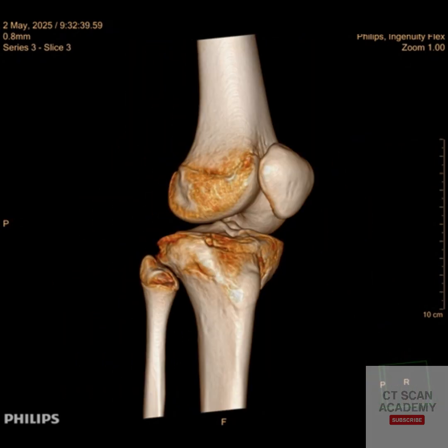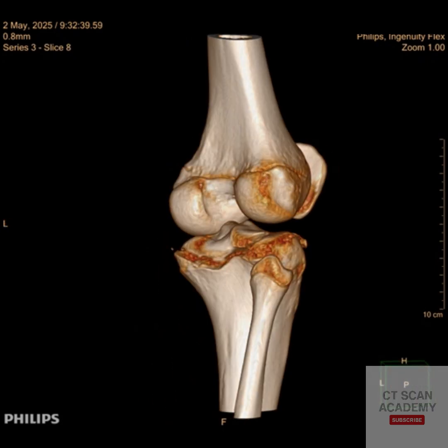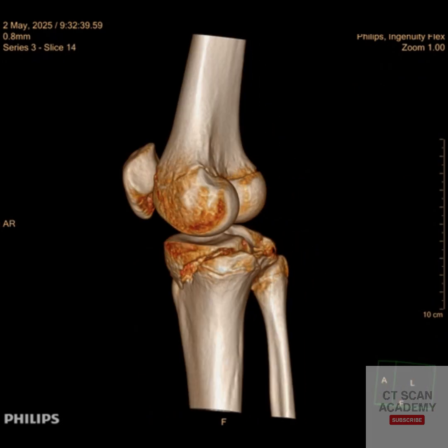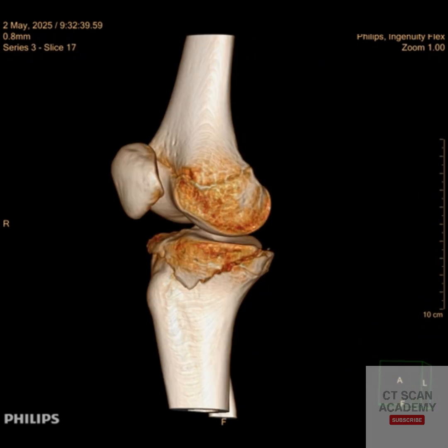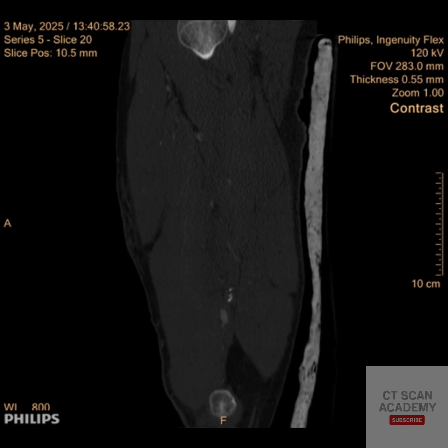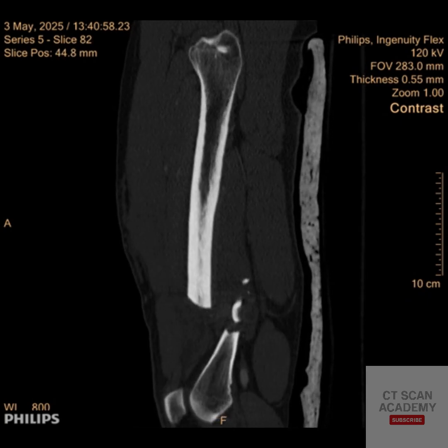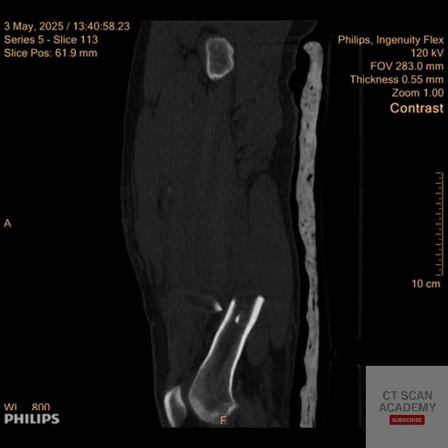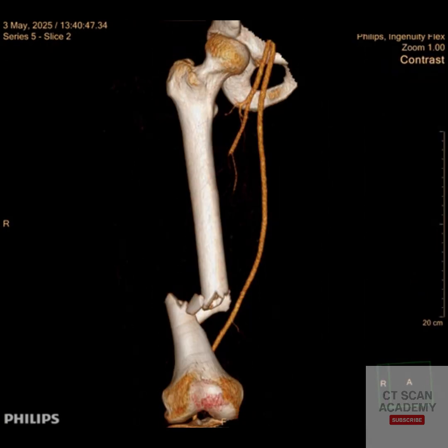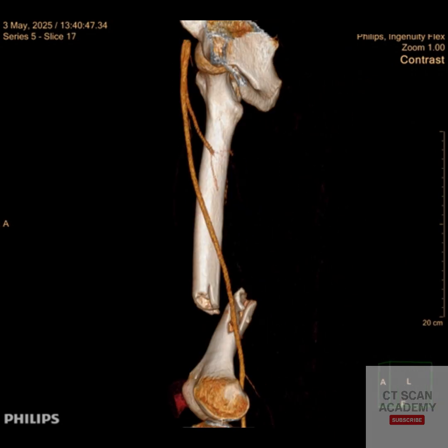Another case shows a tibial physeal fracture, which requires specialized surgical evaluation due to potential damage to the growth plates, possibly causing limb growth disturbances. A transverse femoral fracture with displacement is present. Due to the risk of vascular injury, femoral artery assessment is mandatory.